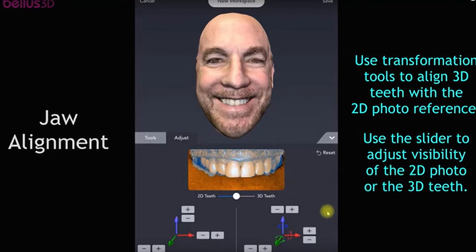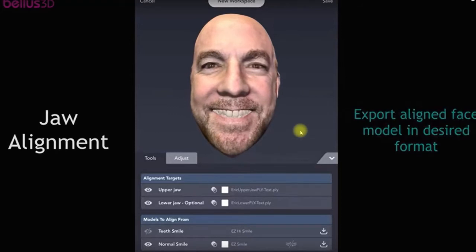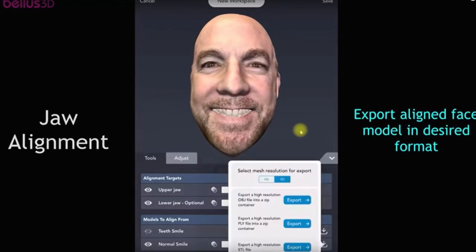And you just kind of sit there. These are your yaw, pitch, and roll. This is up, down, left, right. And you got to do it till it's perfect. I would have me look at that in the beginning.